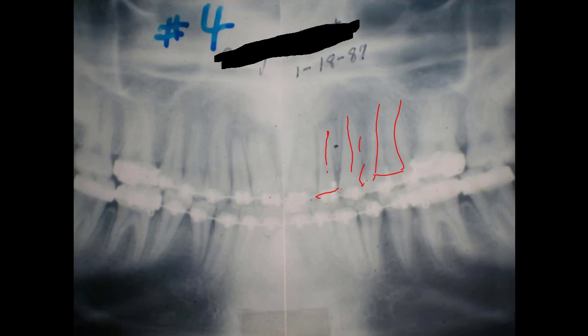I don't think it looks too hot. I don't think we had too much to do with that. This tooth right here, it needs some tip to bring this root back in this direction. So you'd have to kind of go up and come down like this and come back up, and that would hook it in there. You have a little sloping area across that tooth, and that would force the root back in that direction. Other than that, everything looks quite good.